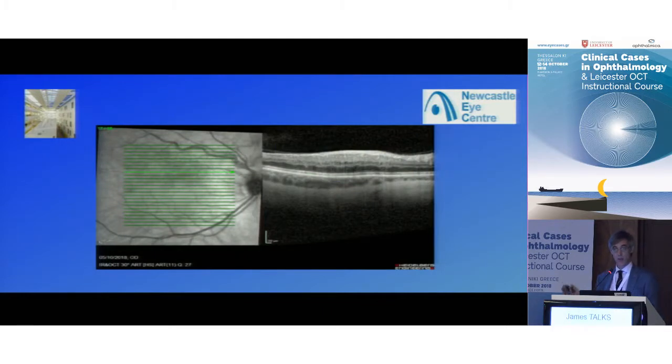So it is beginning to swell, but it hasn't actually developed specific cysts. And the vision's very good. So I have to say I'm not sure what the right answer to this is. In other words, you can see thickening without specific localized cystic spaces. Just the whole retina is beginning to become maybe more spongy and beginning to thicken up, which we see more clearly on the map than we do on the cross-section.